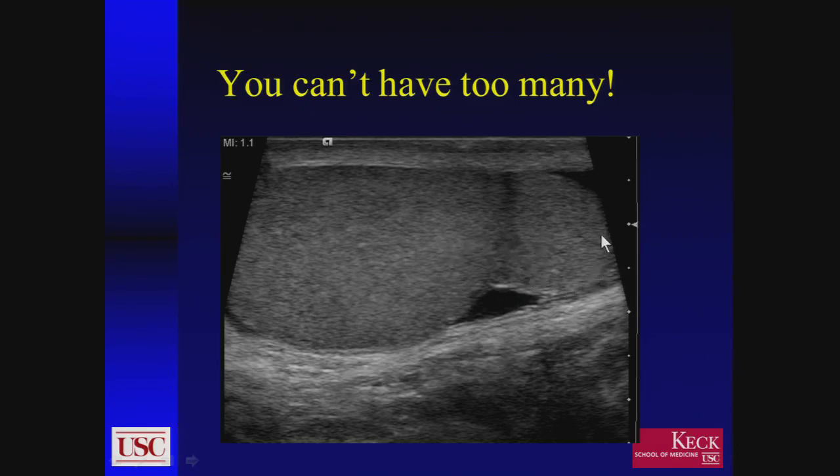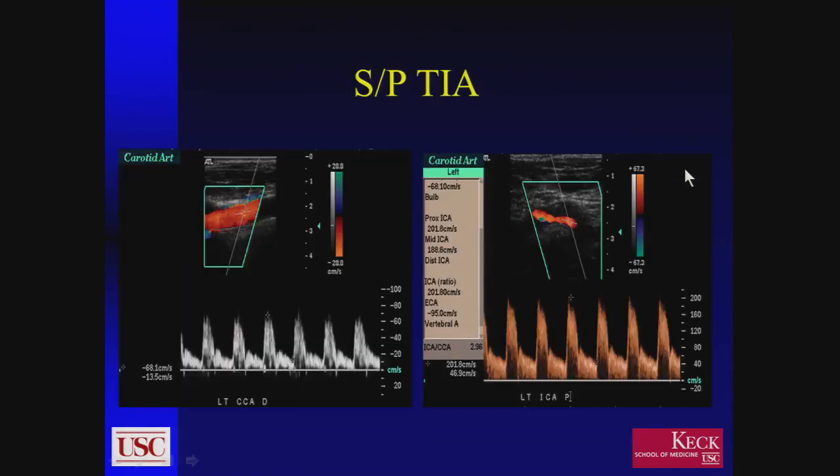But I don't think anyone would have too much trouble saying the blood supply to this was similar, the echogenicity was similar, this is probably not a tumor. So just do keep in mind that sometimes there may be some extra things hanging around in there, and that they don't really want to go to surgery. So, completely changing things here.